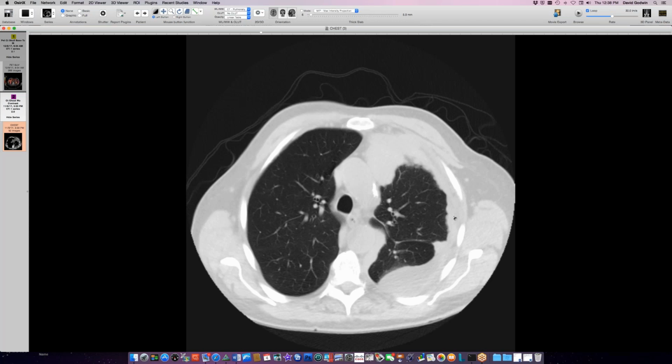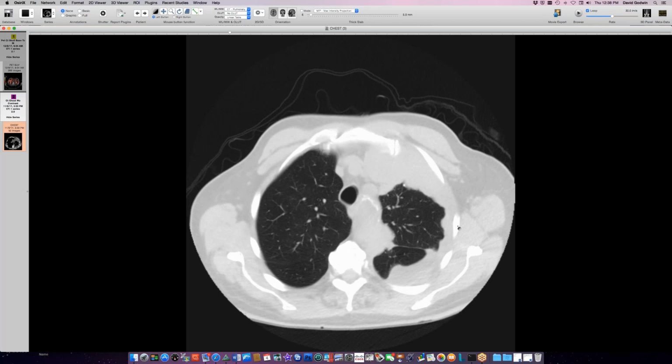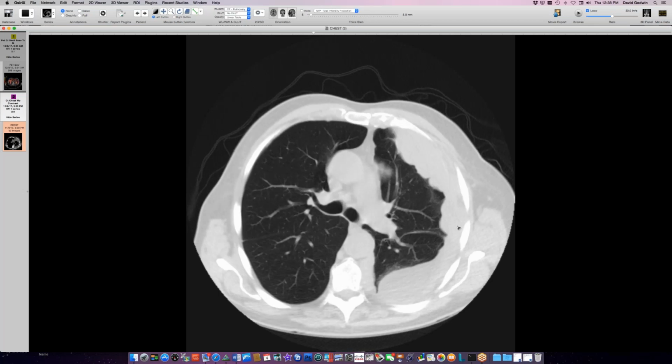So it's not as if you have a big lung mass that eventually gets into the pleura. This probably starts out very near the pleura and then just sort of grows in the pleural space. And so this is really pseudo mesothelioma. And it's really a lung carcinosarcoma, probably. Sorry, a lung, what do they say it? A sarcomatoid carcinoma of the lung.